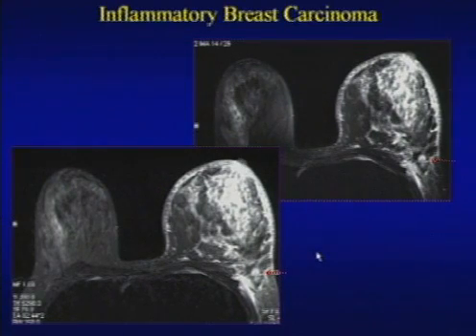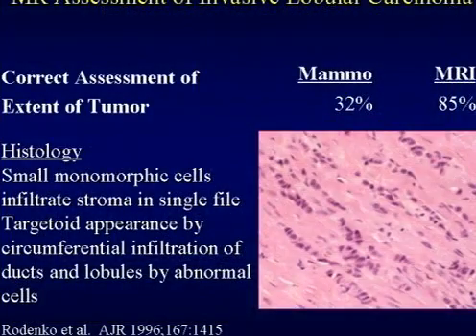Another case is what I showed you earlier, the inflammatory breast carcinoma. I think MRI demonstrates it beautifully. You really get correlation with the clinical breast exam. Right away, you see this left breast is significantly larger than the right. You get to see the classic skin thickening and trabecular thickening. In addition, in this case, you can identify the focal primary tumor in the breast. And I think MR is excellent for monitoring response to treatment, as this patient will also get chemotherapy up front.